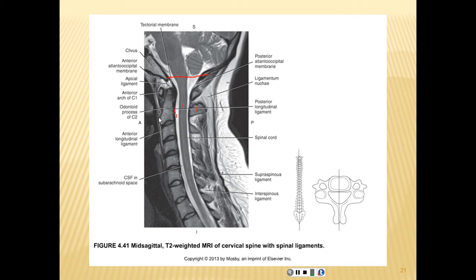You have the prevertebral soft tissue. And remember, this prevertebral soft tissue, when we want to measure it, should only measure a couple millimeters. At the level where the esophagus begins, it can be up to 1 centimeter, 1.2 centimeters long. This is the epiglottis that folds down to stop food contents from entering the trachea. It continues on to the back, and then the esophagus will peristalse from the constrictor muscles, pharyngeus muscles, and peristalse down the esophagus.